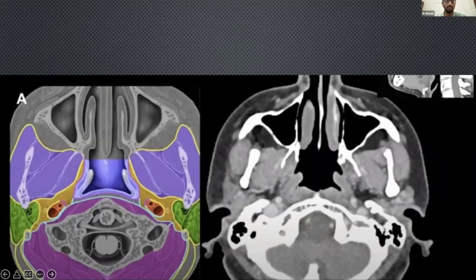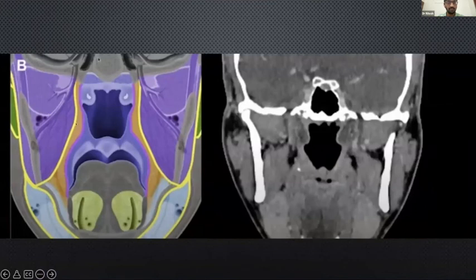And then we have the perivertebral space. And then we have the retropharyngeal space, which is common. It can have abscesses, and it will almost reach up to the mediastinum also. And then when we come to the next, in this coronal image, this will be the parapharyngeal space. This is the parapharyngeal fat we have. And this is the masticator space. And then this will be the submandibular space.